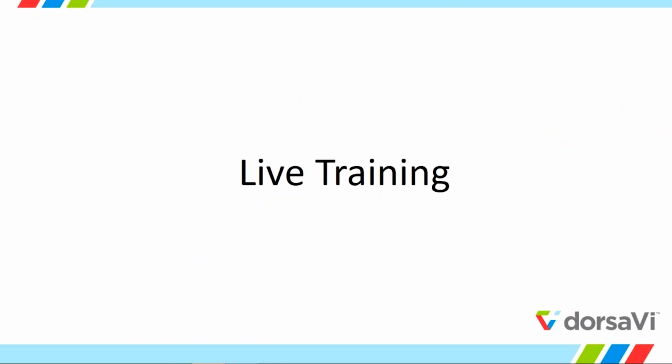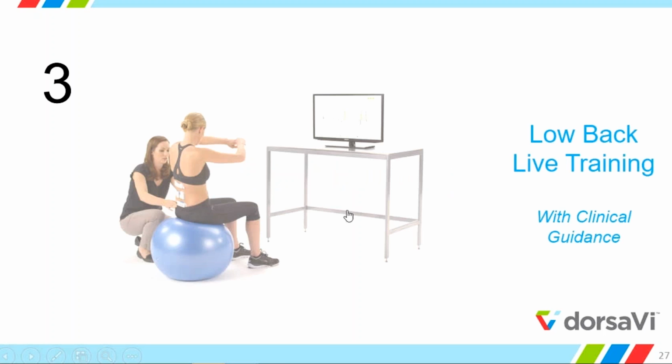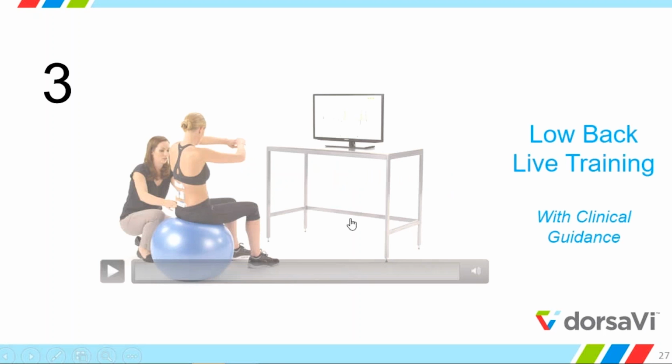That was great. Okay, so the next one is live training. Live training is part of the lumbar spine. You guys might know that we have movement challenges. That's another module separate from lumbar spine, but live training is within the low back assessment itself. I'm going to play this video, and please, Joanna, let me know if you guys cannot hear it.